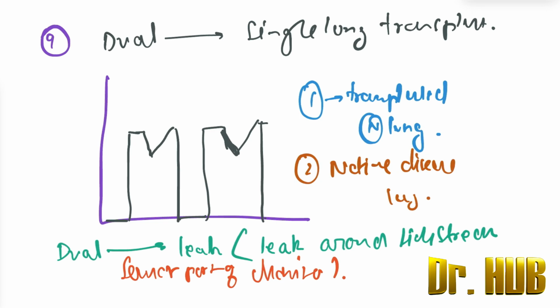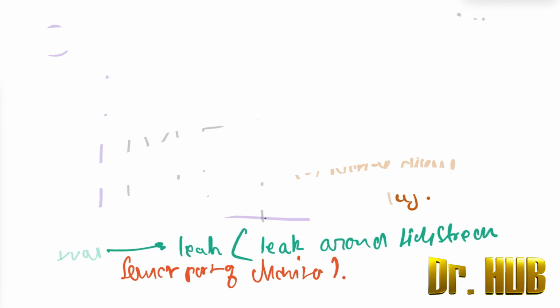So I've seen so many: bronchospasm, expiratory valve malfunction. So this will be number 2, 3, 4, 5. This is going to be the number 10. So under number 10 we will see the malignant hyperthermia.